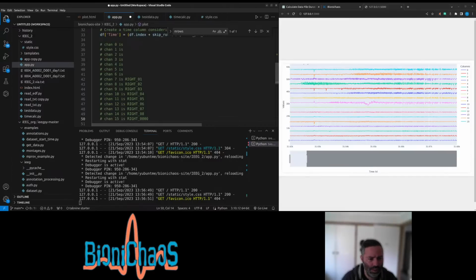Right, 15. This will be in theory left 08. We'll double check. Right, 15.